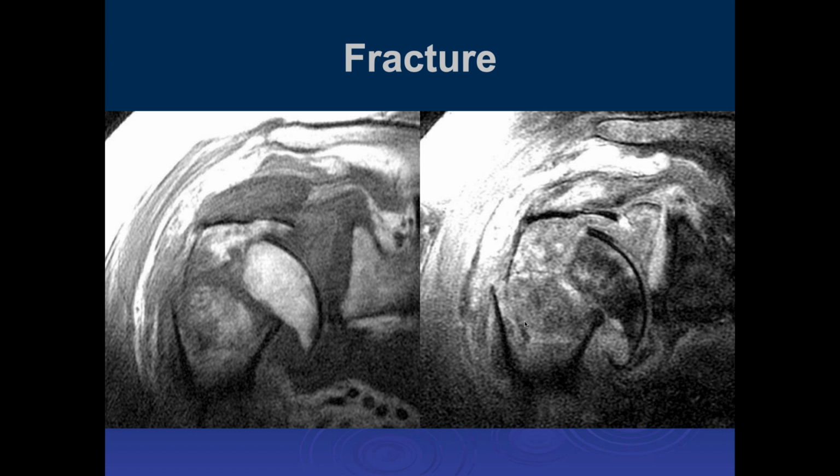So here we can see the articular surface of the humeral head, or the dominant medial fragment, is displaced inferiorly in relation to the glenoid. We would measure that. We don't know how much of that head is there because we only have two views. Yes, that's very true. And there's also some mild impaction.